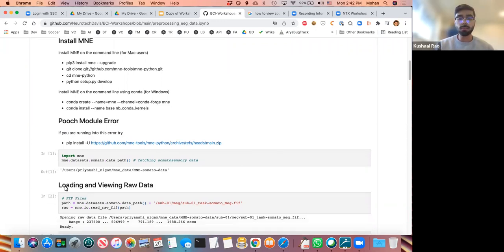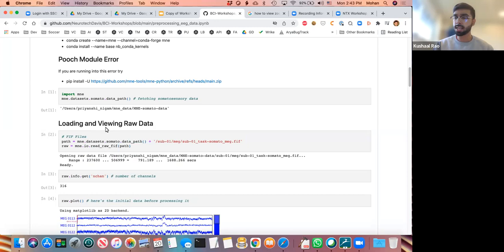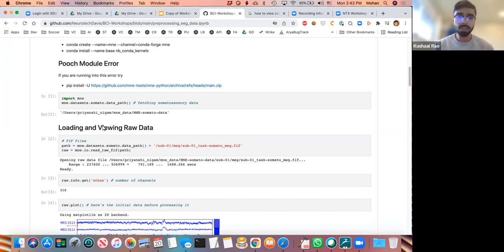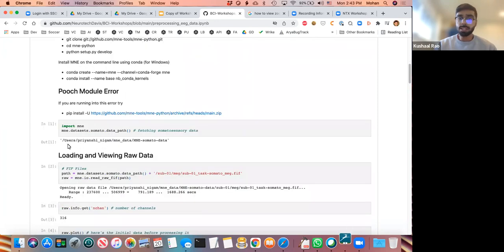And this is especially helpful when you're trying to plot data like so, because you can directly write a line of code and see its corresponding plot without having to write a bunch of lines of code and have them all populate in one single go. So it's very iterative. You can walk through it. You can annotate and comment exactly what you're trying to do. It makes for a very readable, very easy to follow case study sort of format for code, which is really nice. So once you take a look at this notebook and once you follow all of these instructions, you'll basically have your first cell open for you.